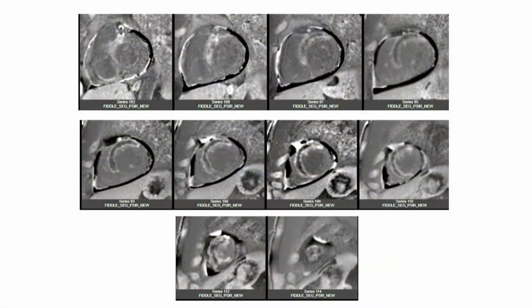Okay? So in this case, for example, you see the black area, right? But you see there's hyperenhancement all around the black area in 3D space. The other thing, and you're probably going to show this to us later, is the other distinguishing feature: if it's microvascular obstruction, the dark area progressively gets smaller over time, right? As contrast eventually makes its way in. Whereas if it's a thrombus, that doesn't occur.